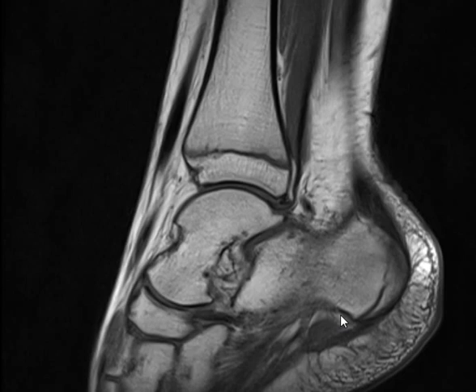If he has Achilles tendinitis, he has no swelling and there's no fever. But here we just need to see the edema at the tendon insertion. Tendinitis means inflammation, not infection. Inflammation is different from infection. In infection, there is a bacteria causing infection. Inflammation is just inflammation, just edema, just edema at the site of tendinous insertion.